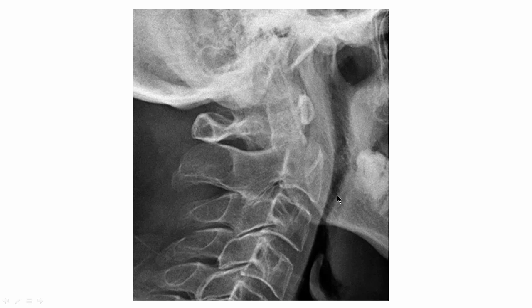Every time you look at a cervical x-ray, check the anterior longitudinal ligament. Okay, it looks pretty good, right? Posterior longitudinal ligament looks pretty good. Okay, so far stability looks good. I don't see any anterior listhesis. Now let's check the spinal laminar line. Where was that? Here's the spinous process, and here's where the lamina comes in. See it? Kind of this curvy thing. So we would be able to draw a line up just like this. Looks real nice.